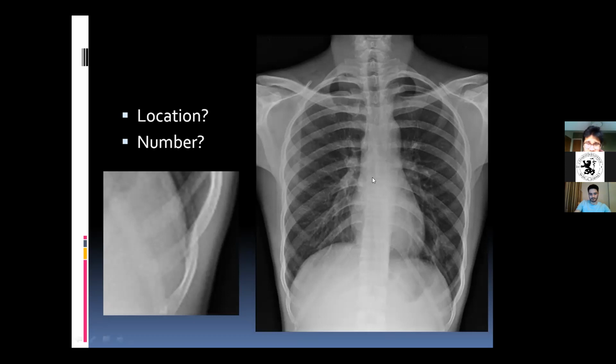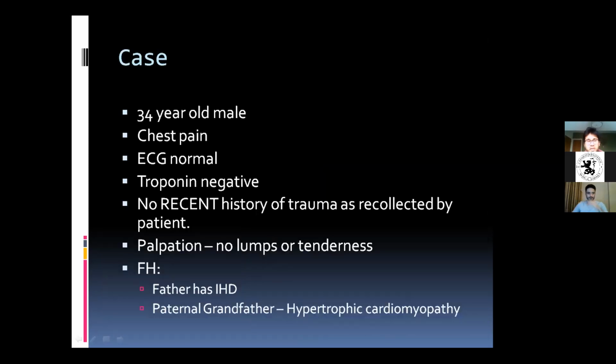It's just left-sided chest pain. Exactly. That might be a pleural rub. Yep, exactly. But apart from that, nothing else. So it's very, very hard to identify fractures that are so subtle without the actual symptoms at all. Okay, so this is one of the subtle fractures.